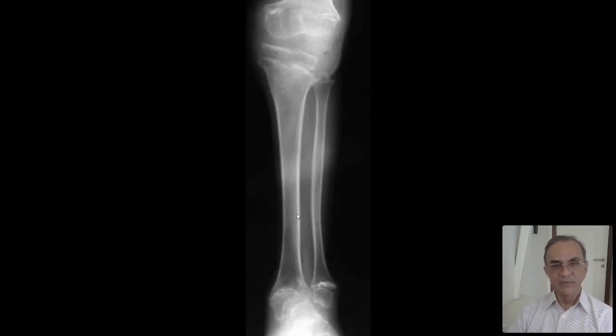This is another example of metaphyseal dysplasia in an older child. Okay, short bones, which doesn't happen in rickets. Sclerosis of the margins, no cupping, no fraying. Look at the lower end of the fibula. Okay, most people will call this rickets. This is not rickets because the rest of the epiphyses are normal, metaphyses are normal, and the bones are short, which doesn't happen in rickets. You may fracture, but the bones are not short. Look at the distal metaphysis of the fibula and keep that in your mind. This is not rickets, but metaphyseal dysostosis.